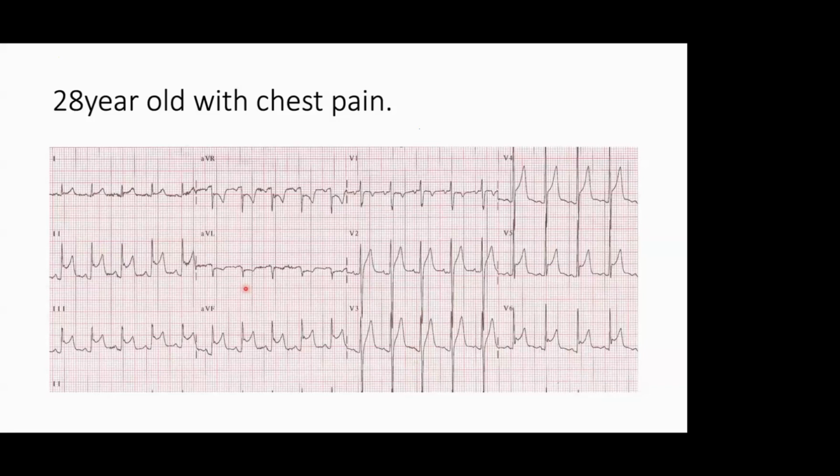Then what are the other points of ST elevation? Other 5 points. Any loss of QRS height from V1, V2, V3? We are seeing it serially going up. No loss actually. No loss of QRS. You see the S wave, it is not affected at all. And the ST segment is not like a convex upward.